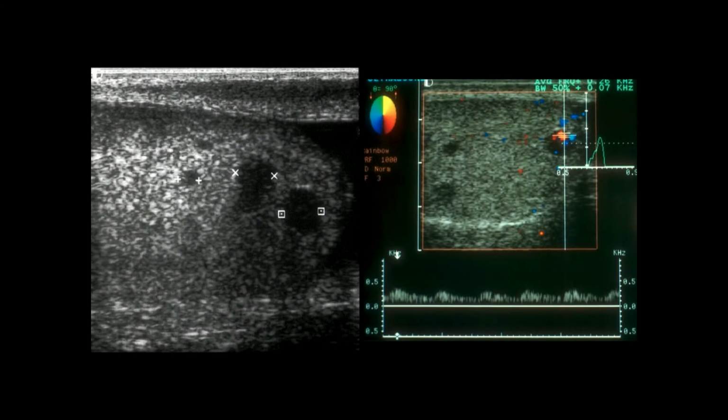Changing venues, we have 3 or 4 bumps in the testicle bilaterally. They're not abscesses because they have blood flow in them right there. This is a Caucasian, turned out to be sarcoidosis. We totally blew this case, because we didn't have the leading clinical history there. But I give this talk in Southeast Asia and people just yawn and say, it's another case of TB. So granulomatous disease, whether tuberculosis or sarcoid, can give you multiple bumps in the testicle.